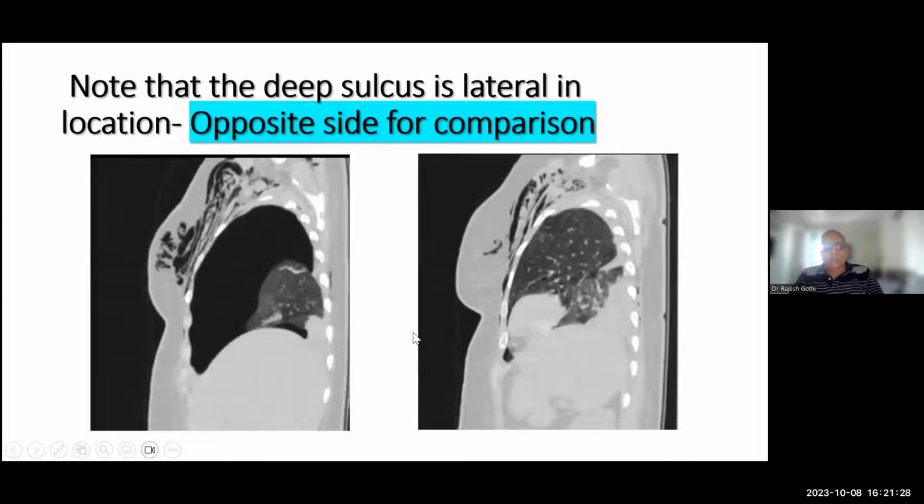So now this patient came for a CT scan because the pneumothorax was not draining. The large anterior pneumothorax. This is the opposite lung for comparison. This is the anterior part of the diaphragm, posterior part of the diaphragm, collapsed right lung, focal consolidation in the right lower lobe. This is the opposite side, small effusion.